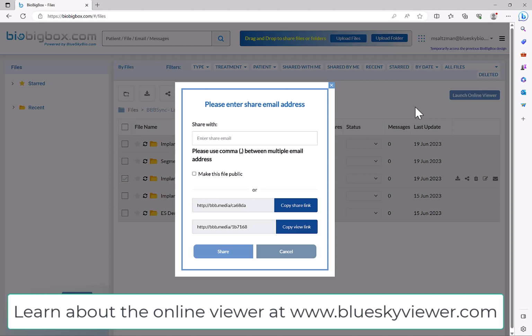You could share your cases via the viewer. And if you send somebody the view link, then the case will open directly for them when they click on that link. So that's regarding viewing. Now let's take a look at the online viewer.